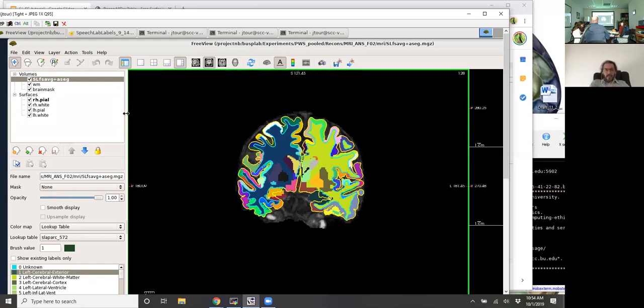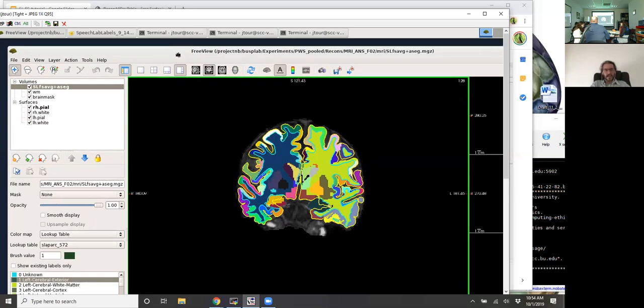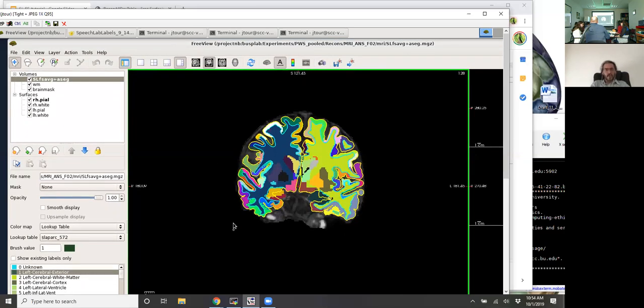Perhaps we can add it to our scripts so that when it generates these files, it generates a sidecar .txt file that contains a copy of whatever labels were used at that time, because these parcellation files might also change over time, and that makes our job of interpreting these files considerably harder, because we don't know if we are using the same version of the parcellation file that we have right now, or perhaps when these were generated, they used a different version.